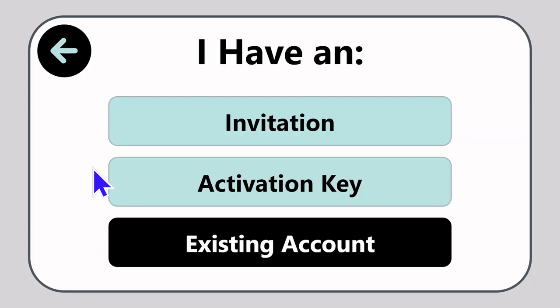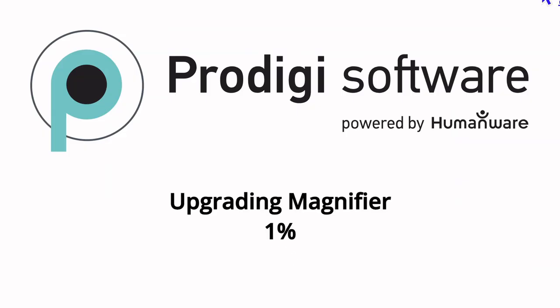You will do this process only one time. And once you've done that one time, if you install onto another machine, you will be able to use existing account to complete the activation. But you'll now have a username and password combination that you can utilize. But once you've created that password and continue on, the installation process will look and continue on exactly the same. And that's what I'm going to demonstrate from that point forward now. After I've completed that process of creating a username and password, the installation continues on as we're seeing now. So I'm just going to let that go.